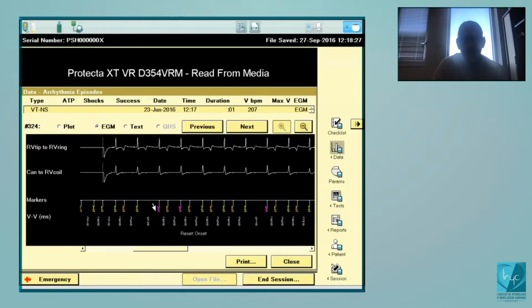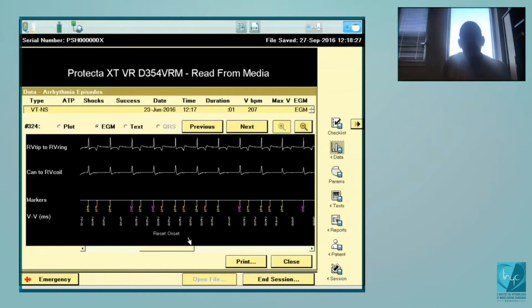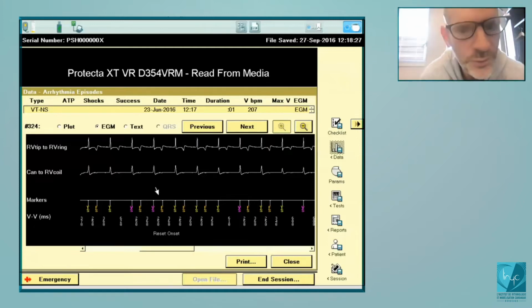You see the alternation between two signals, one sharp, one smooth, one sharp, one smooth, with oversensing of the T-wave. Okay, is this a difficult diagnosis? No, and that's a point. That's easy to do, and if it is easy for us, it may also be easy for the device to differentiate these two signals. Because one is sharp, one is smooth, and that's how the Medtronic algorithm works.